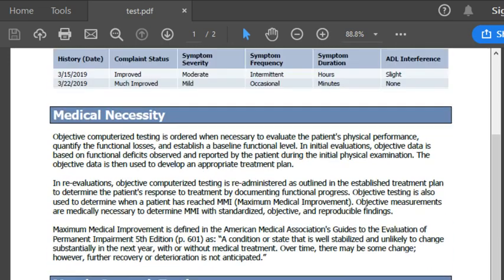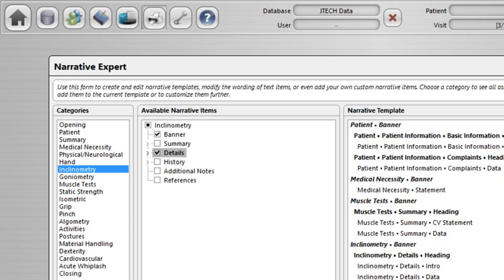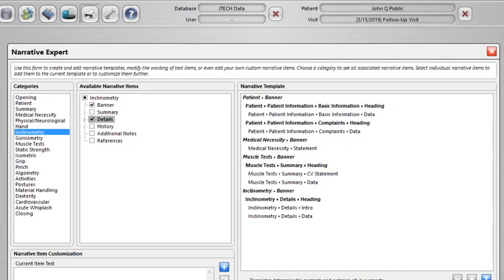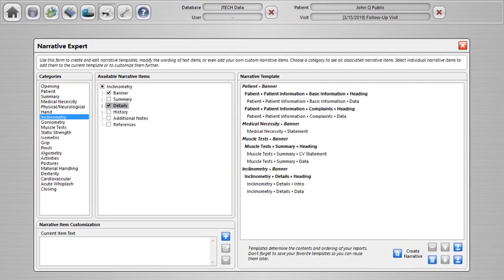So that information, you can reconfigure it, change it, make new custom templates as well, and essentially just set that report up so that very easily in the future you can regenerate those reports in a way that you see fit. So we're going to go ahead and switch back to our Northstar program, and we'll make it a little bit easier to see here once again. There we go. And basically that more or less comprises the basics of the use of the Northstar software, as well as a quick summary of some of the changes.